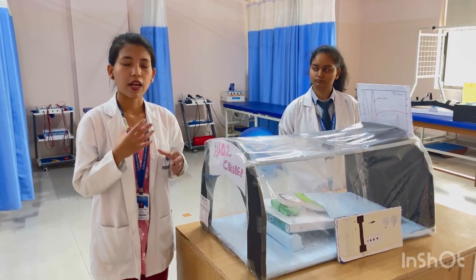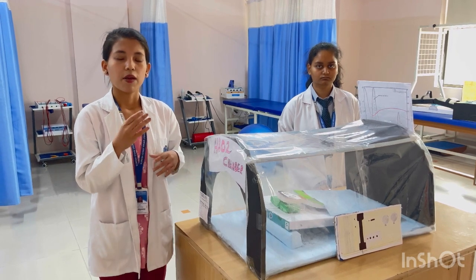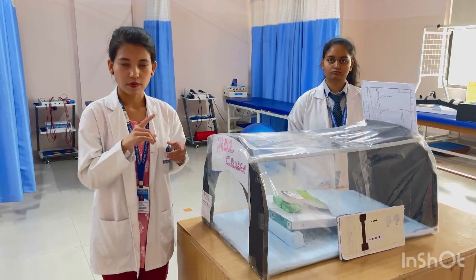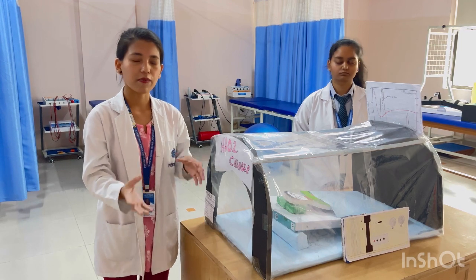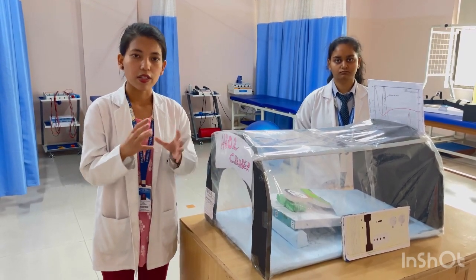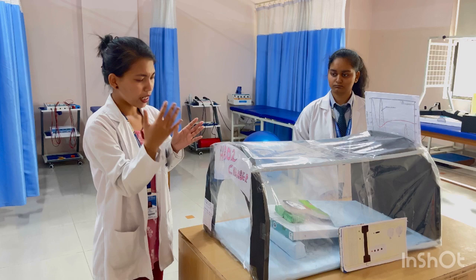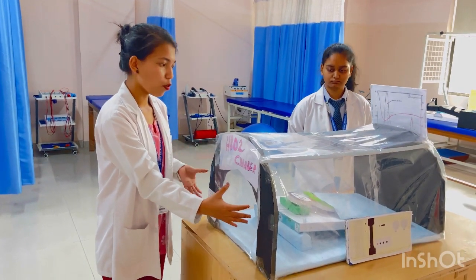If we give an adequate amount of oxygen to an individual, the number of cells, mainly RBC and WBC, increases. And the first mechanism is that neutrophils kill the microorganisms that enter our body. Their number and their ability to kill the microorganisms will increase, and the bacteria will start being killed. And here we are presenting the monoplace chamber. This is only for one person.